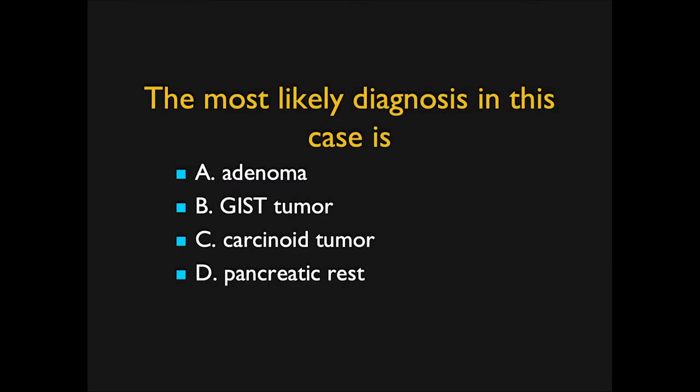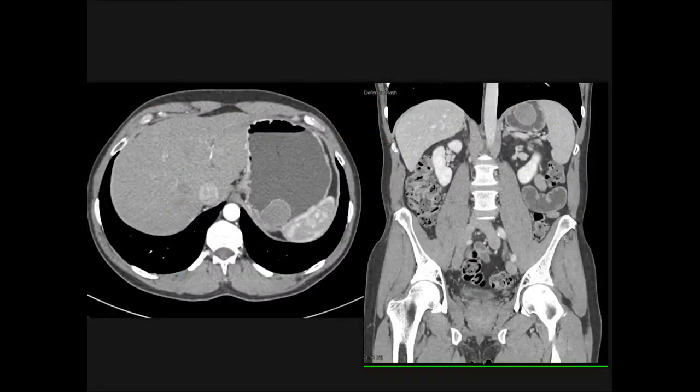Now in this case, this is fairly easy. I just like this case because I wanted to remind you about giving oral contrast, be it positive or water. There's a mass, low density in the stomach. You can see the coronal view, how it hangs down.